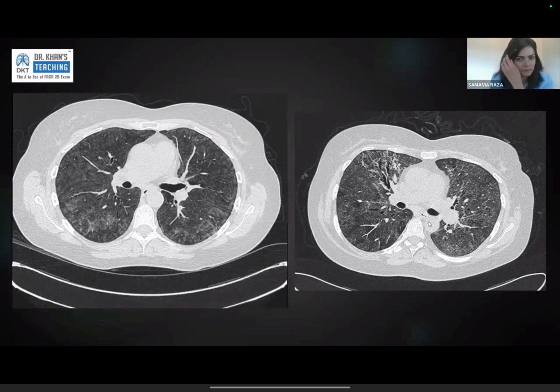So this one, you can see that this patient does have ground glass or centrilobular nodules, but you can also see that they started to get that architectural distortion. The bronchi have started to dilate. They turn this squiggly, irregular, beaded appearance. So that means that the lung around it is getting a bit fibrosed, a bit distorted, a bit abnormal.